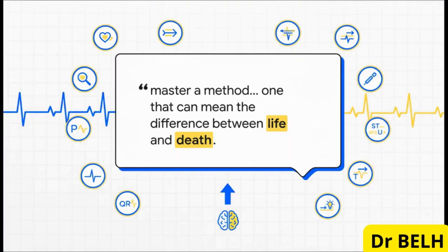Okay, so let's get right into it. We're going to cut through all the noise and give you a foolproof 7-step checklist. This is the kind of framework that makes sure you never, ever miss a critical finding. It's going to take you from feeling completely overwhelmed to feeling confident every single time you look at an ECG.